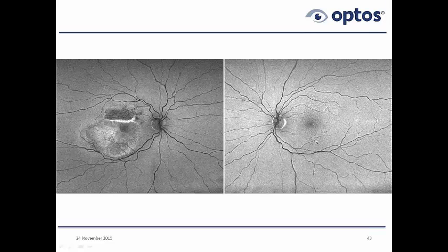These typically are associated with the drusen and with the retinal pigment epithelial changes. This patient was dry in the right eye as well for a while, but then went from dry to wet macular degeneration. So here's what it looks like, about 2 months after the patient developed symptoms. He came in late. He was on vacation and didn't want to interrupt his vacation.